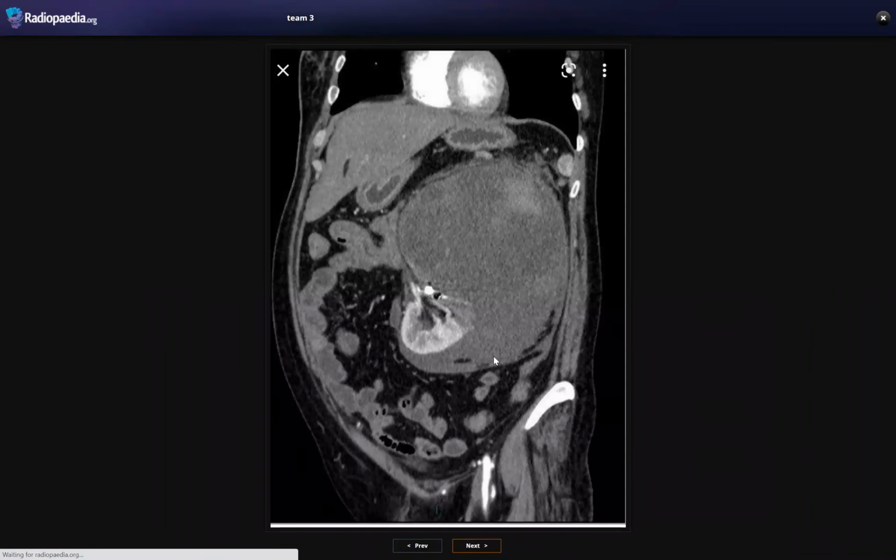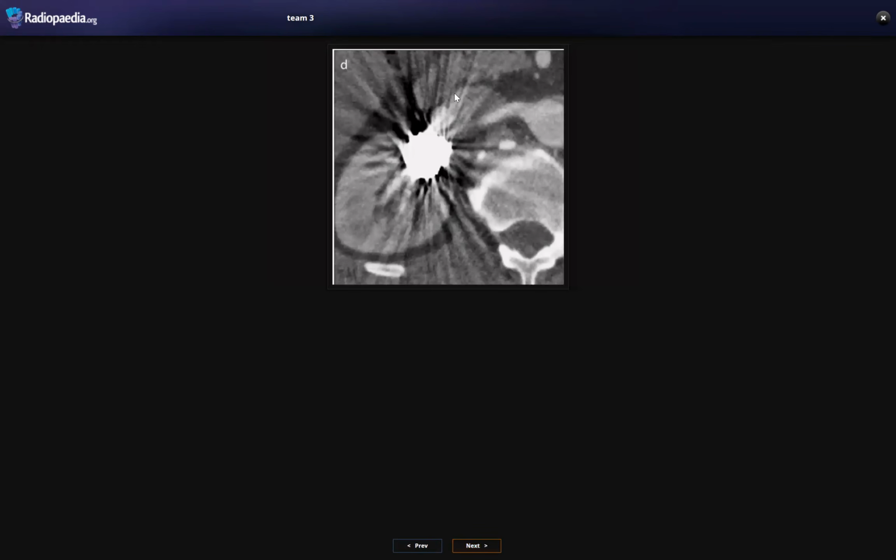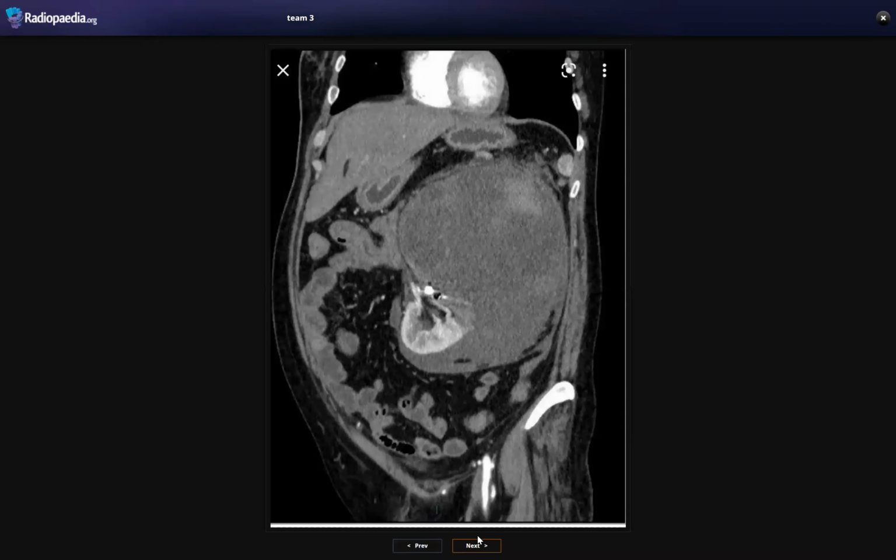I mean, a case with the same diagnosis. This is an acute retroperitoneal hematoma, but I am asking, what is this? Aneurysm. No, this one also. Checking another one. This one. What's this? This is, I don't know, it's throwing a lot of artifacts. So is it a calculus, looks like, or some metallic density? Patient referred to interventional radiologist because of that acute retroperitoneal hematoma. Then on the follow-up, this one is seen, or like this one. Do you know what this is?